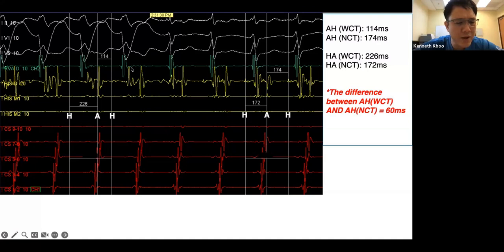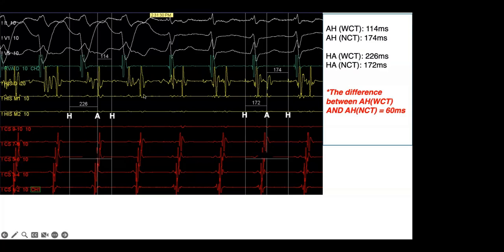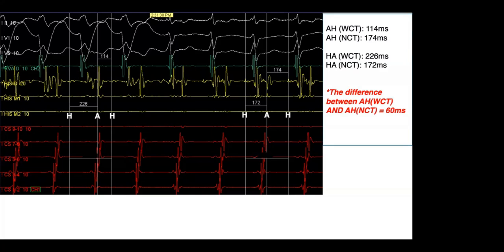And I didn't measure the HA interval in this particular segment. I'm not sure if this is the same as this. Can I ask you why? Yes, please. You're measuring within the transitional period of the left bundle branch block becoming a narrow complex. Look at the septal ventricular EGM. They're not stable. Can you see that? Septal ventricular EGM, those four wide complexes, they're all different. His bundle EGM, ventricle. So you got HV, V EGM.